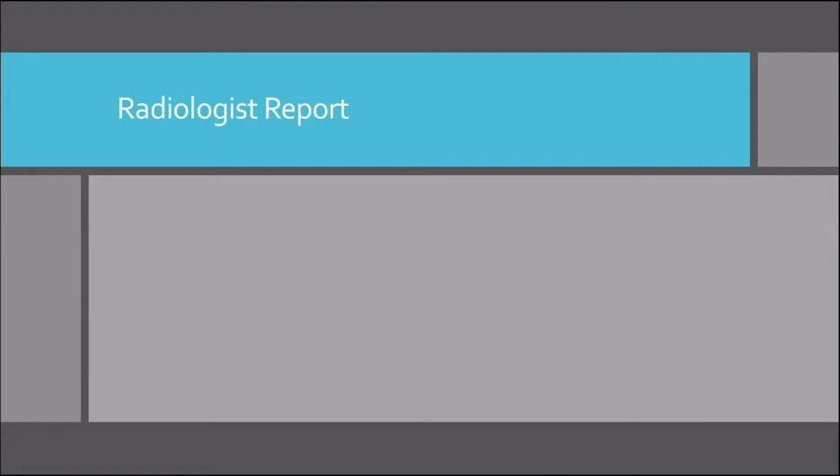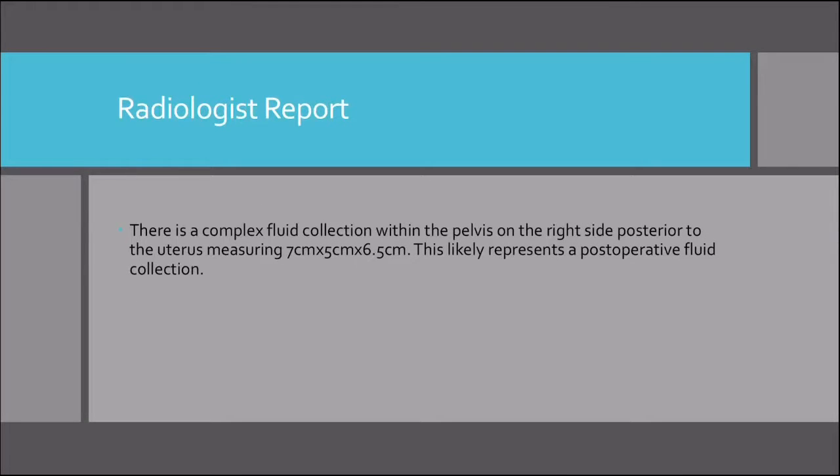They also noted that there is a complex fluid collection within the pelvis on the right side, posterior to the uterus, measuring 7 centimeters by 5 centimeters by 6.5 centimeters, and they said that this most likely represents a postoperative fluid collection.